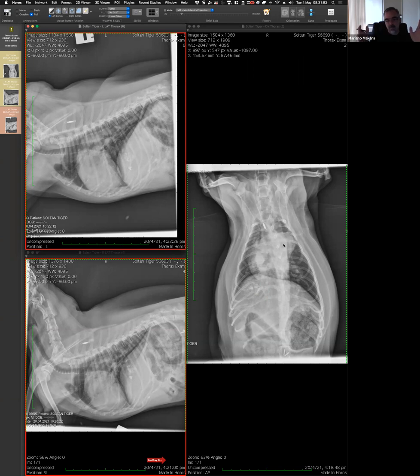So try to tell me which from all of the findings. Well, I think that putting that together makes sense. So now we are finding good fits. We are testing this disease. How well does that disease fit into what we see? And then maybe someone else comes with another hypothesis, and then we see how well it fits. And then how far we can go. Then we may go to a point where, boom, we can't go further than having these two options. But we need to play this game. Now we know all the little pieces. What's the best hypothesis? How can we put all of this together?